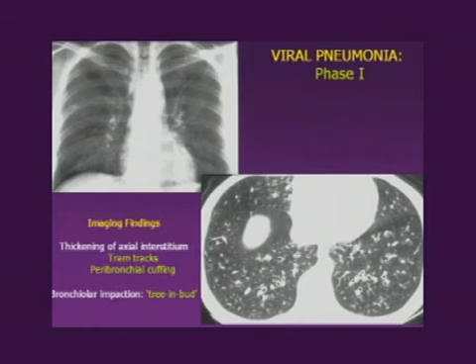This can be a tough call, but on the high-resolution CT to your right, we can clearly see that there is thickening of the bronchial walls. We can see both ring structures and bronchial walls in the plane of section recognizable as tram tracks. And we also see bronchiolar impaction. These small centrilobular dots, some of which are forming V and Y-shaped structures, represent bronchioles which are impacted by inflammatory material and cells, causing a tree-in-bud appearance. This is a viral tracheobronchitis.